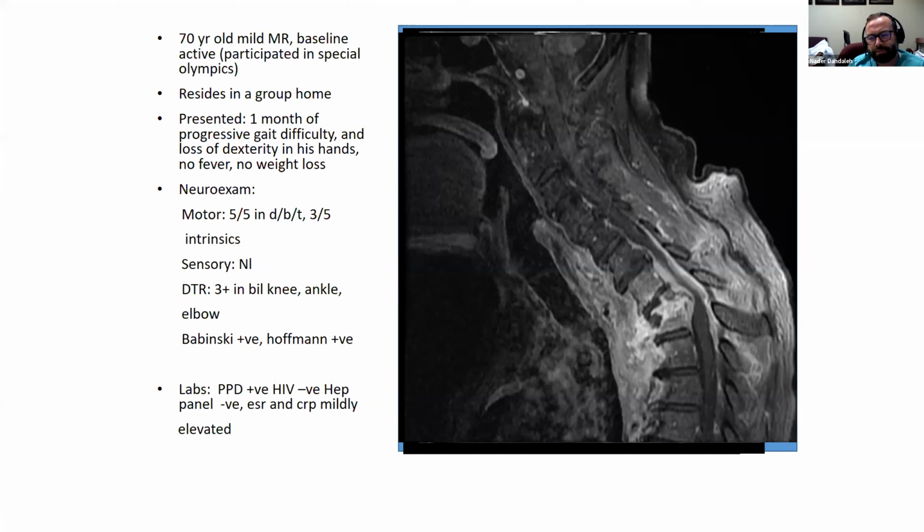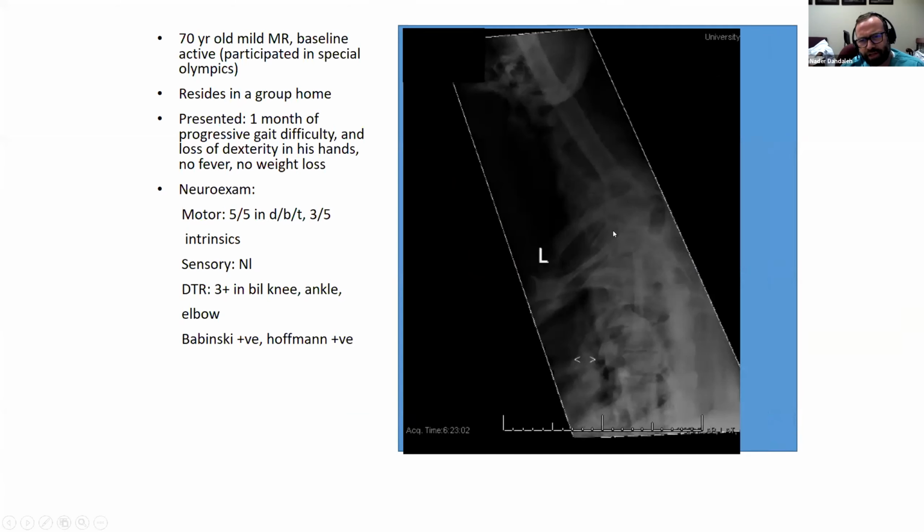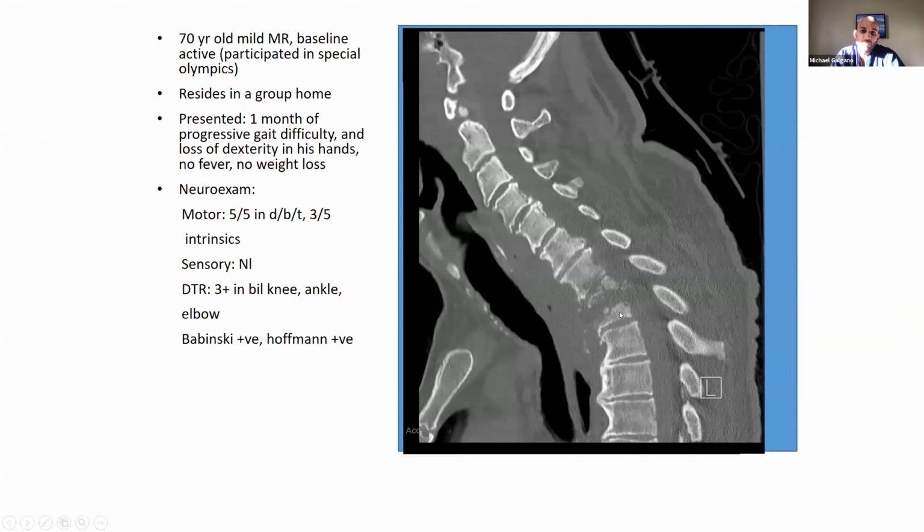Michael, have you got any upright X-rays on the guy to see what his alignment looks like? Maybe some supine X-rays, to see how flexible this is. So that's the upright X-ray. Can't see much because of the shoulder, and you can see he's a little kyphotic. And that's how he lines up when he's supine, obviously, with the CAT scan.